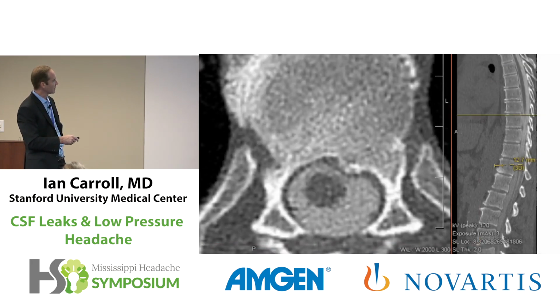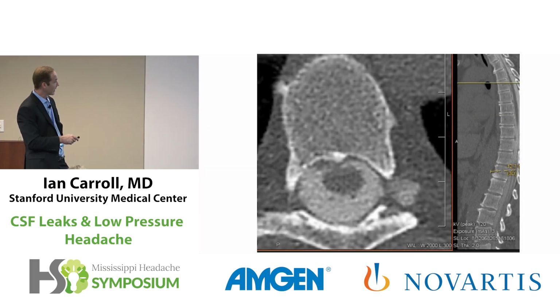Unfortunately, she's got other levels where she's got calcium poking in at the thecal sac as well, there and there. And so now we have a problem of riches. Too many places where we have suspicious things that can contribute to leaks. These aneurysmal dilatations and calcifications.